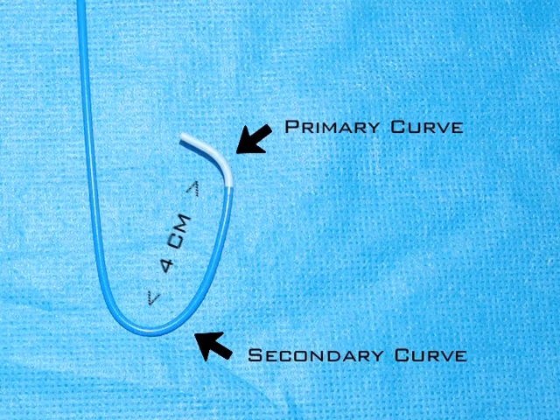Catheters are long, thin tubes like pieces of spaghetti made of plastic. The designation JL4 or JL3.5 indicates Judkins left 4 centimeter, indicating the distance between the tip and the secondary curve.